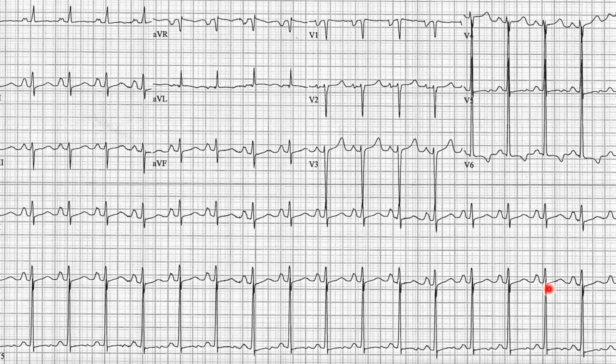If we looked at the space between each beat, these are pretty regular, so you could try to do that. One big box gives you a rate of 300, two big boxes 150, three big boxes, which is right about there, maybe a shade under, maybe a little faster, gives you right around 100, and that'll equal out for both sides. So it seems about right. We'll call this a rate about 100, truly a rate of about 102.